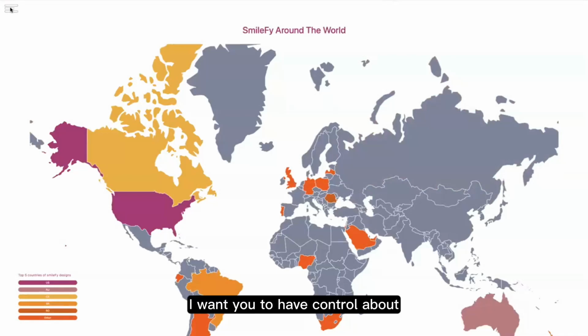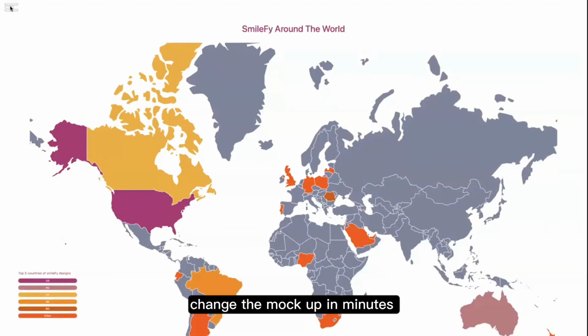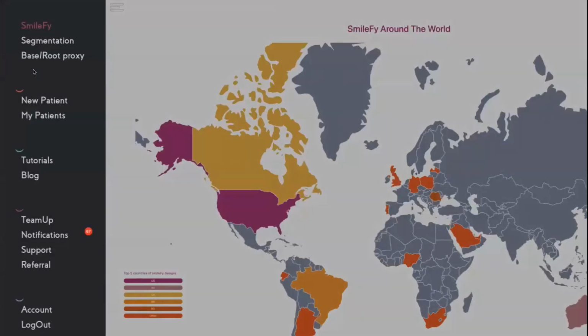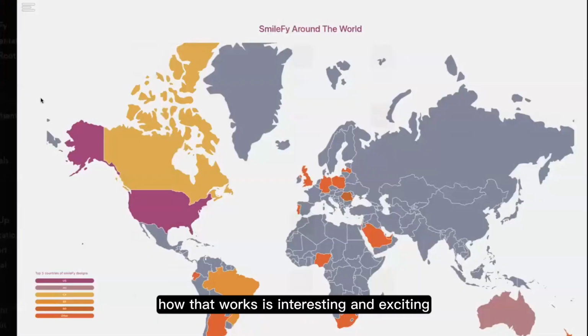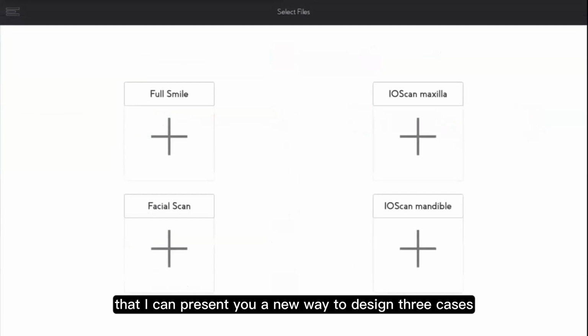I want you to have control over the case and the mock-up. Change the mock-up in minutes when you have to, and then print the mock-up in the first appointment. How that works is interesting and exciting, and I'm very happy that I can present you a new way to design 3D cases.